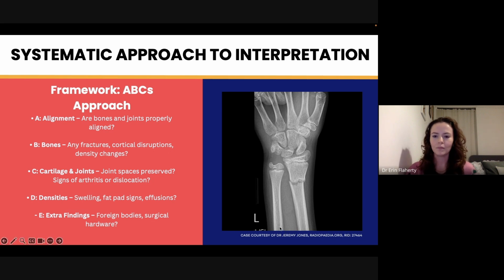So do the bones generally look like they're in the right place? And at first glance, you could probably say, yeah, they sort of do. You know, your ulna's sort of straight, your radius is a bit crooked, but generally in the right place. The carpal bones generally look all right, and these are in the right place. You're pretty happy that the wrist looks like a wrist.